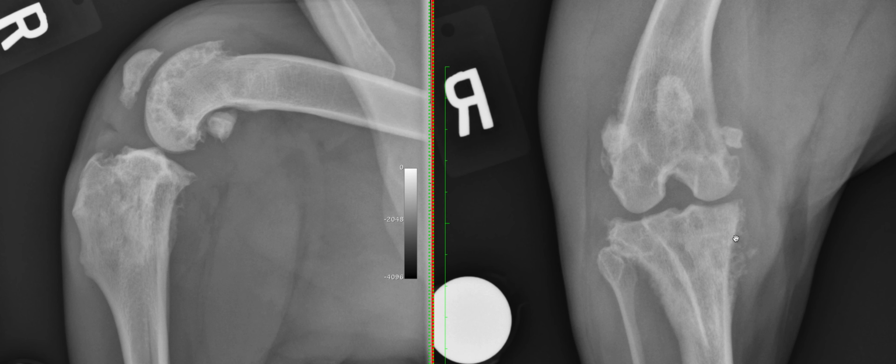So, as you can see, this radiolucency here as well on this distal femur, those would indicate some subchondral erosions or lesions. So that would be another sign of aggressiveness in that joint.